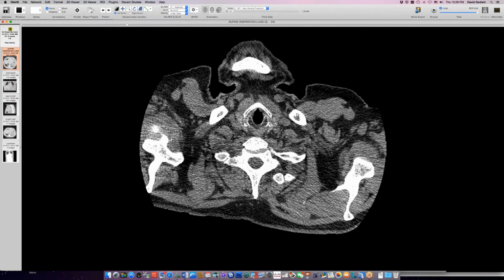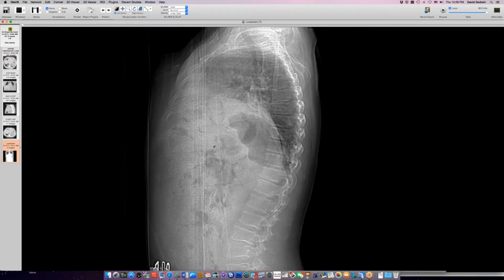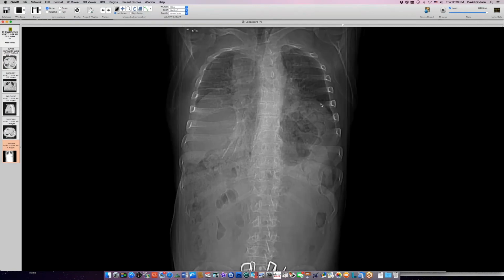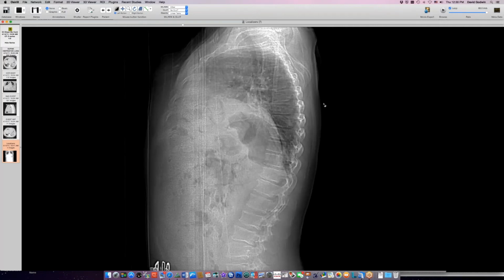And let me show you a third case here, a diaphragm fluoro that I was asked to do. This person has very low lung volume and has elevation of both hemidiaphragms. On lateral view, and unfortunately the lateral scout is all I have, the hemidiaphragms are both elevated, but there's a pretty steep descent posteriorly, which implies the possibility that this is really large eventration rather than paralysis, because the hemidiaphragm in paralysis tends to maintain a high but shallow arc that goes all the way posteriorly. And this one dives back here. So this could be large eventrations.